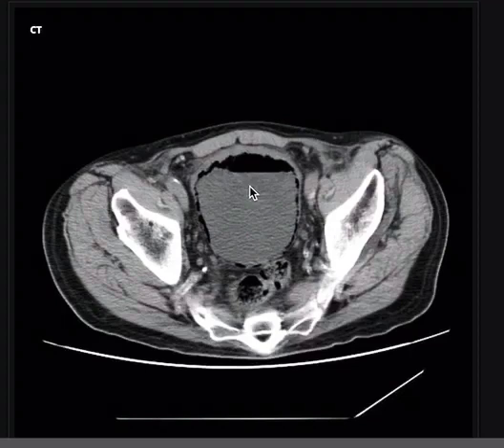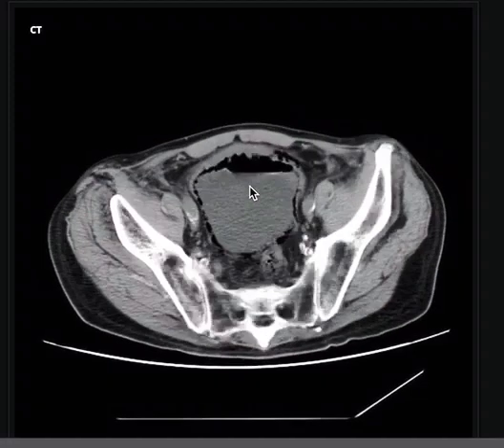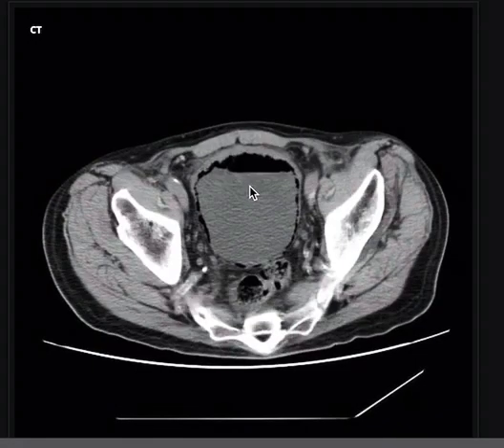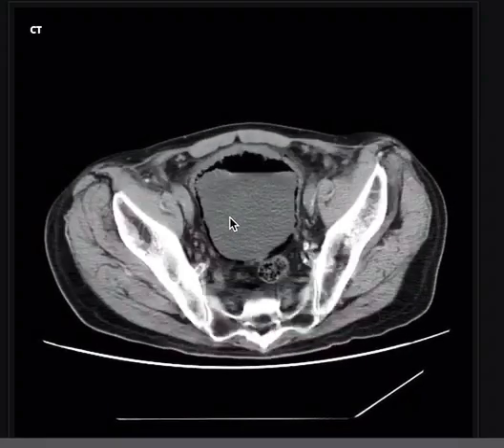If there is no history of catheterization, the differential diagnosis is broad, including fistulous tract from bowel, such as in case of diverticulitis or colonic abscess, or colonic cancer invading the bladder. So colovesical fistula may produce air within the lumen of the bladder, and many other possibilities such as infections or prolonged catheterization. But air in the wall of the bladder, intramural air, is much more serious, so it is emphysematous cystitis.